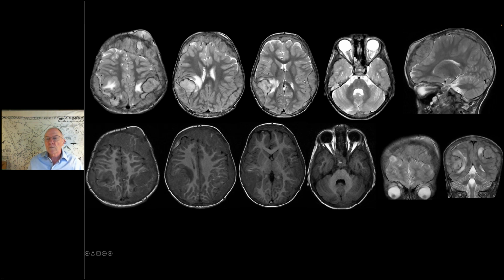Sagittal images, again, you can better appreciate these bony abnormalities. On T1, they are isointense, slightly hyperintense. Foci are demonstrated in the left frontal region. Again, some infiltration in the sphenoid sinus and in the proximal optic pathway on the right.